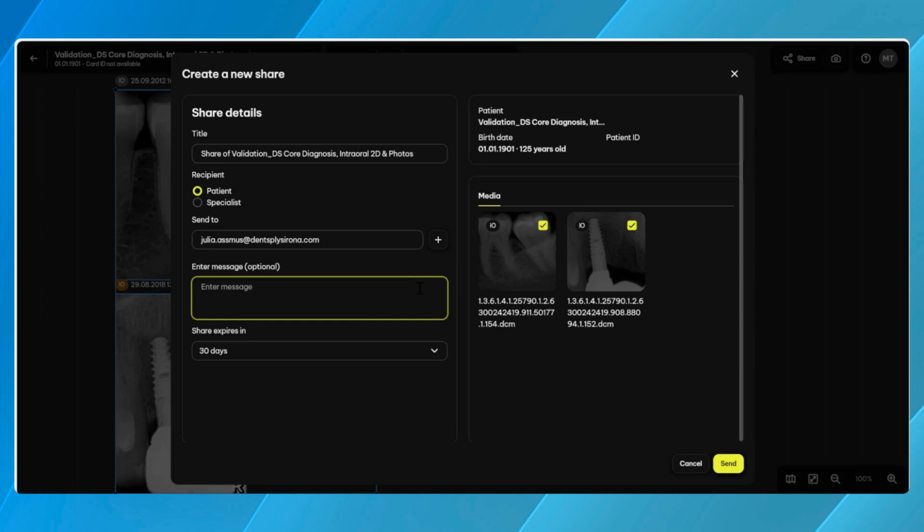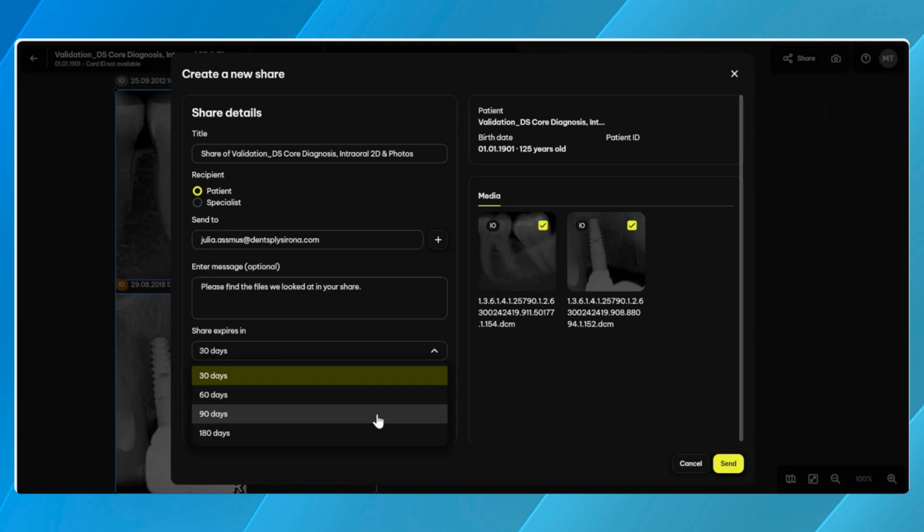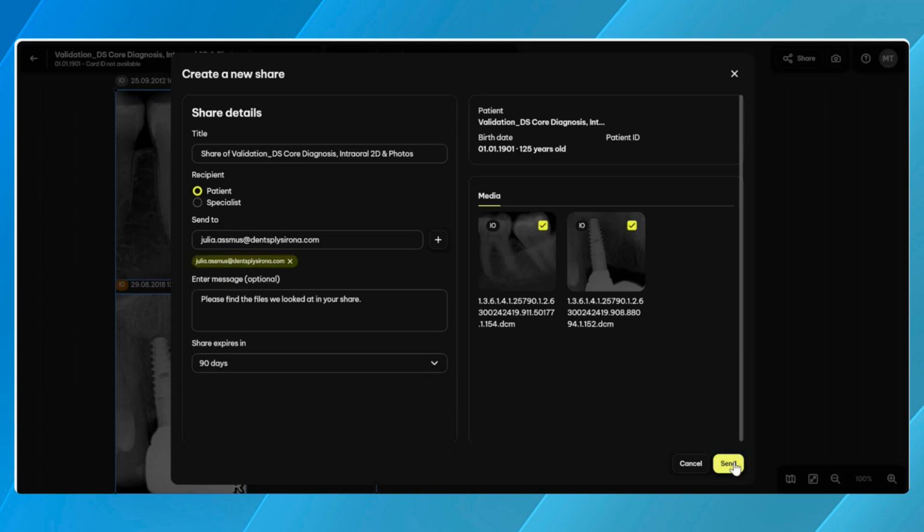With one consistent sharing dialog across Canvas and the media library, the experience becomes more intuitive and unified, making clinical communication and collaboration smooth and efficient.